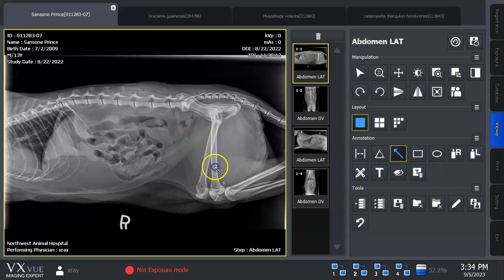The Hide Annotations button will simply hide the annotations from display. It will also lock you out of any annotations further being made. Unclicking on Hide will bring the annotations back to display. And last but not least, the Delete annotation will delete annotations from the screen.